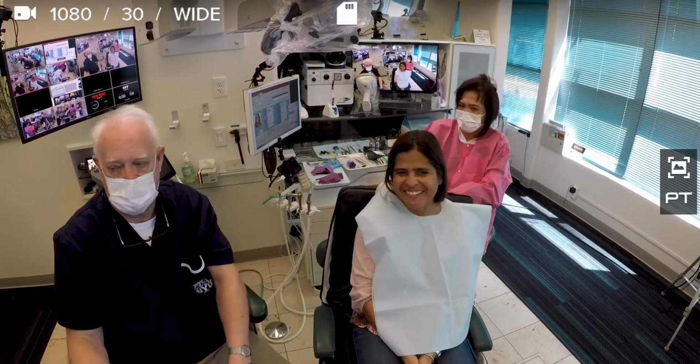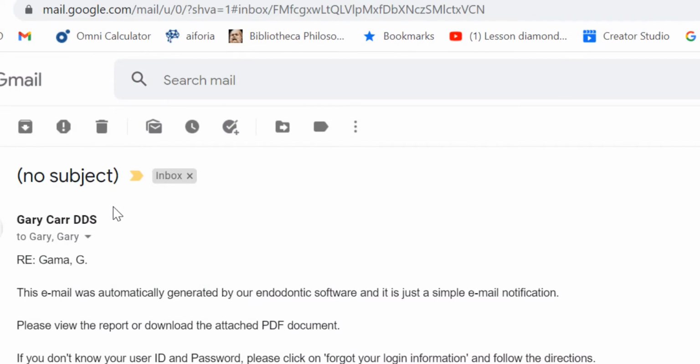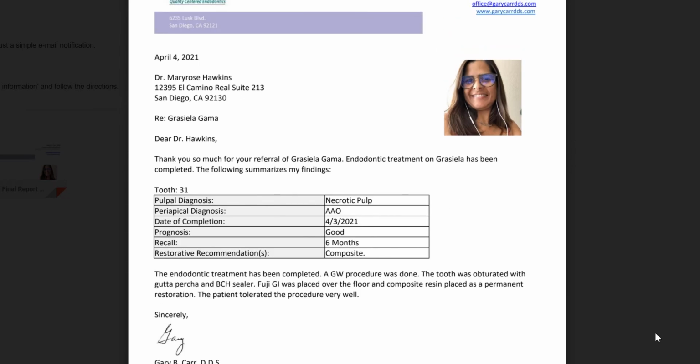Thank you. Okay. The referring doctor selects the email, presses on the link, and immediately reads the report before the patient has even left your office.